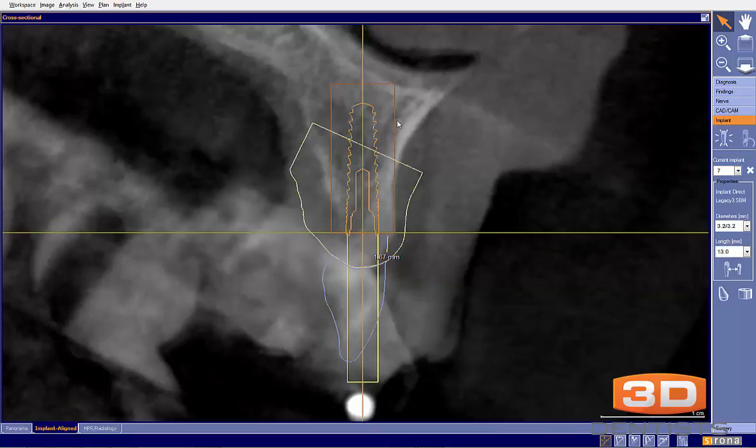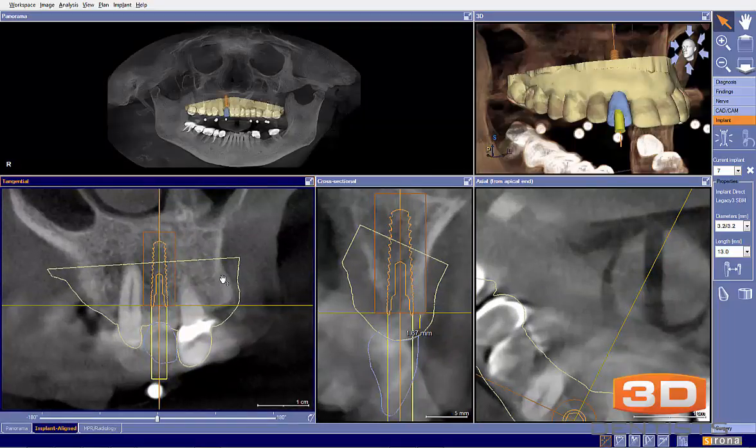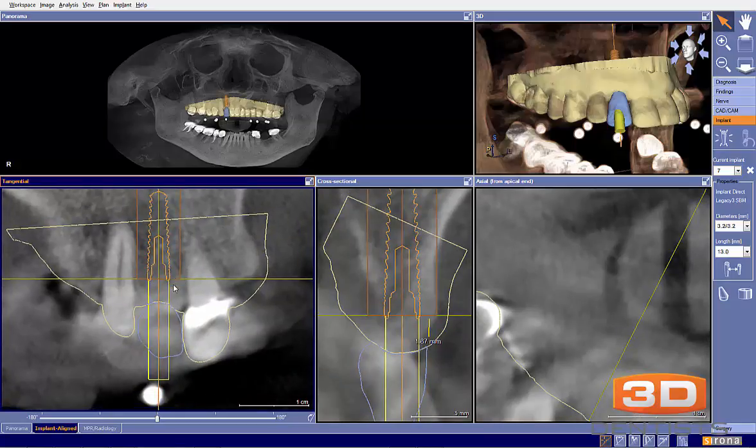If you combine this tweaking of the placement with the use of osseodensification, I think you will have more than enough room to be able to place this implant. Also, we have plenty of space between the adjacent roots, and I can see where the concern is.